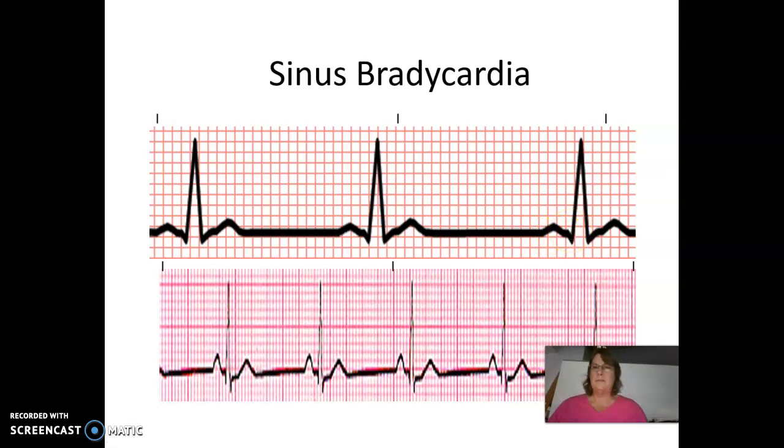Unfortunately, when I put strips in my PowerPoints, it kind of skews my background on this, so it makes it look a little bit fatter, but it looks like it's probably about 3 boxes worth. QRS, now my QRS here looks like it is 1, 2, it looks like it's almost 3.